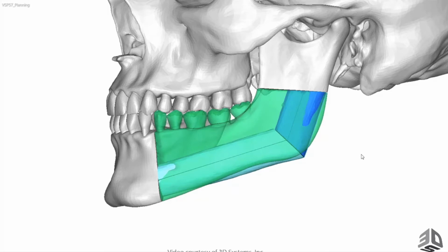I don't have a massive issue with a pedicle that's going to have to come up a short ramus, but if it's a large ramus resection, you don't want the pedicle at the back, you want the pedicle coming out the front.